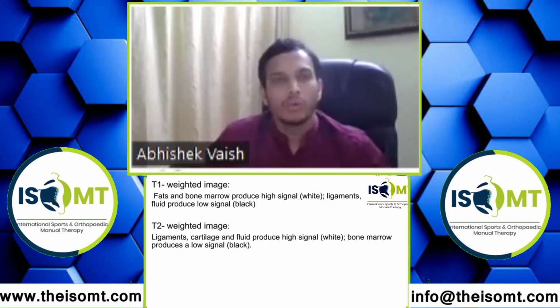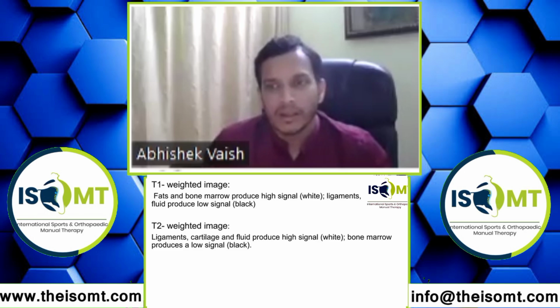Mainly there are two types of images, a T1 weighted image and a T2 weighted image. In a T1 weighted image, you will see fat and bone marrow, which will seem to be white. So it will produce high signal. And ligament and cartilage produce low signal, that is black. In a T2 weighted image, the ligament, cartilage, and fluid will produce a white signal, a high signal, and bone marrow will produce a low signal, that is a black signal.